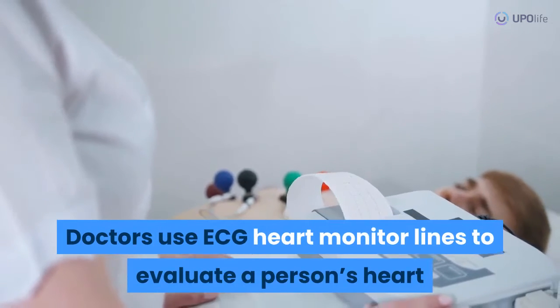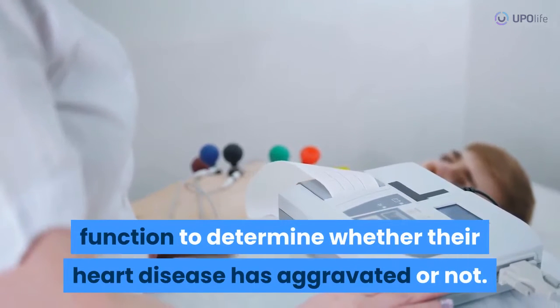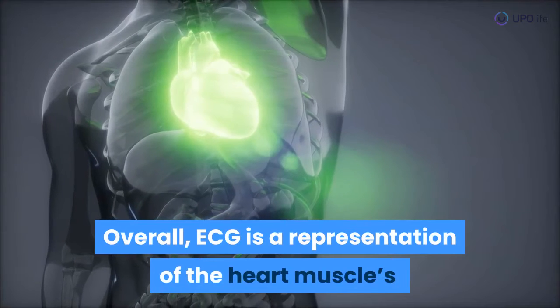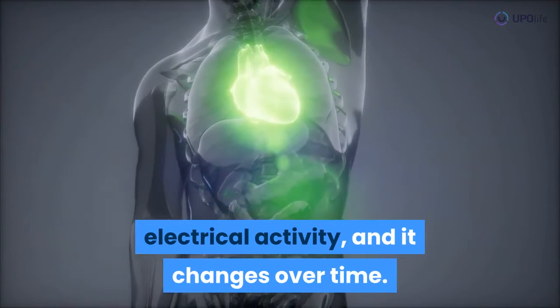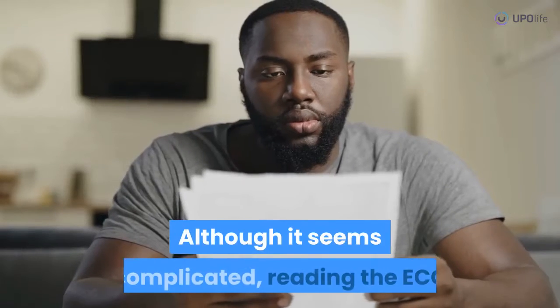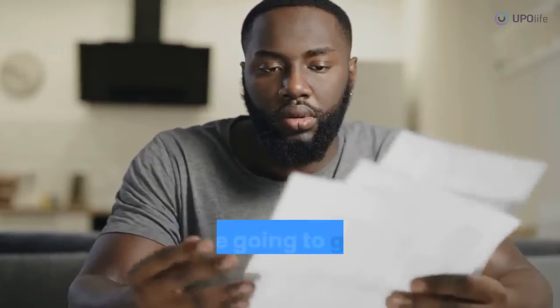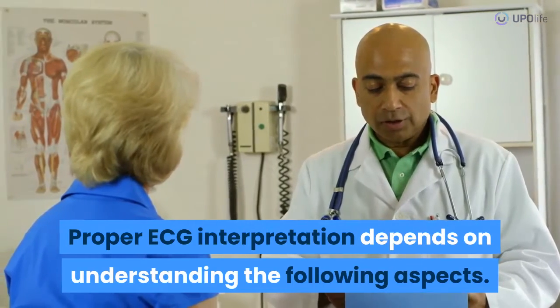Doctors use ECG heart monitor lines to evaluate a person's heart function to determine whether their heart disease has aggravated or not. Overall, ECG is a representation of the heart muscle's electrical activity, and it changes over time. Although it seems complicated, reading the ECG heart monitor line is simple, and we're going to guide you through it. Proper ECG interpretation depends on understanding the following aspects.